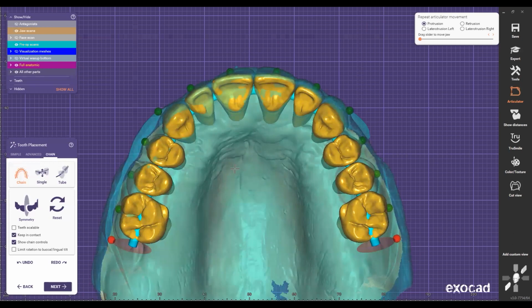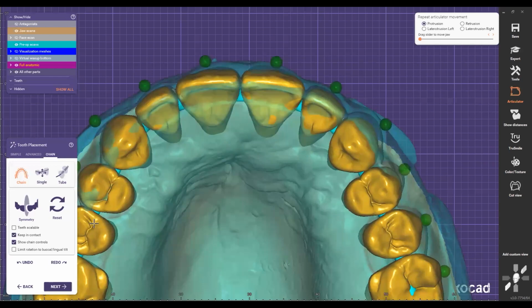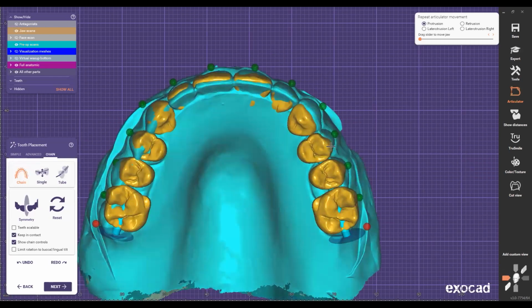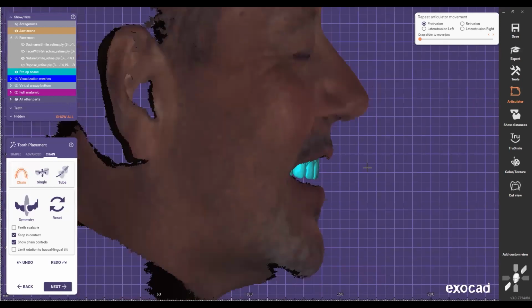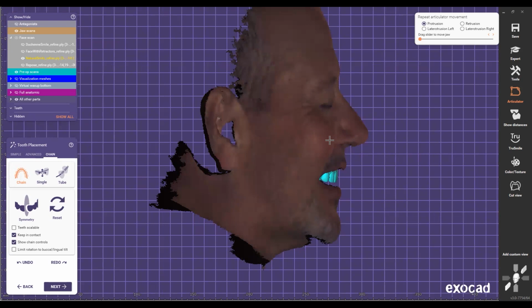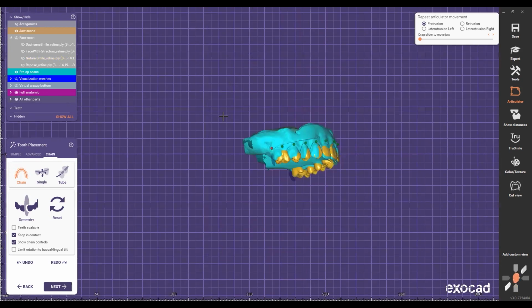Right now I'm following the denture, but I also need to see where the midline is going to be, right? And we said that we're going to have the same right here up to there. I need to see if these teeth are in the proper profile, the angle of these teeth, based on the face. I said, okay, I think these teeth are pretty much good. Maybe a little bit of the incisal edge coming out, but I like them. So that means I'm just going to follow everything there.